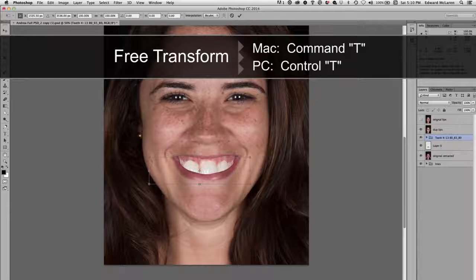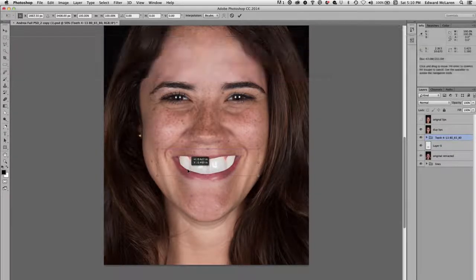That's not what's called the hotkey. All right, now we're just going to center this over about where it needs to be, and you can see they're way too big right now. And I will actually do this with the patient in front of me, and I usually get a big laugh about this point, and that's always nice to do to get patients involved.